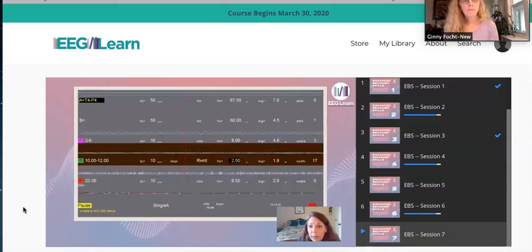Here's another T4 minus P4. And this is another example of someone that has too little difference between T4 and P4. You will see this a lot, because what this basically means is, when you're looking at the alpha activity at T4 versus P4, there's hardly any difference. And chances are there's hardly any difference because this person isn't making very much alpha to begin with.